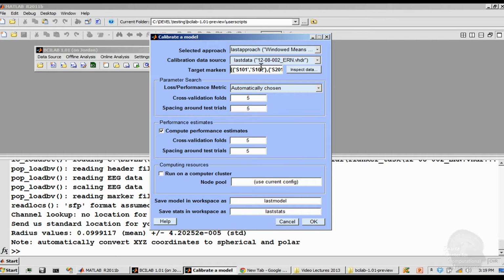So now I'm basically done with the specification. The same line here is also, by the way, in the script, so you can directly copy this. So this is my markers. And then I can go on and say how I want this to be evaluated and so on.